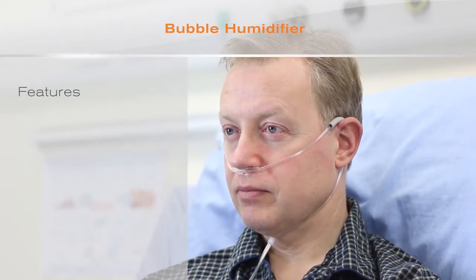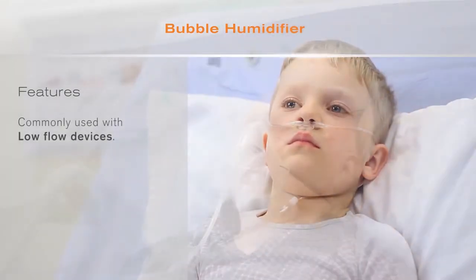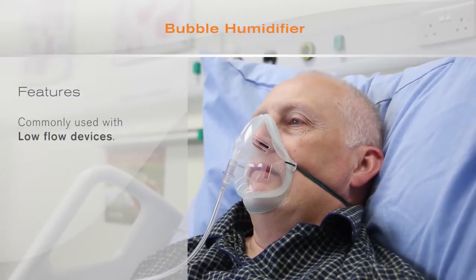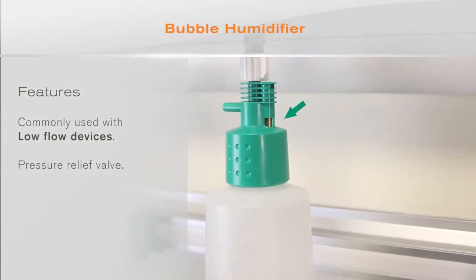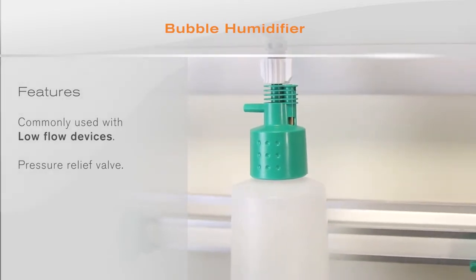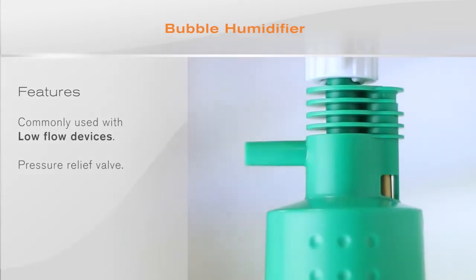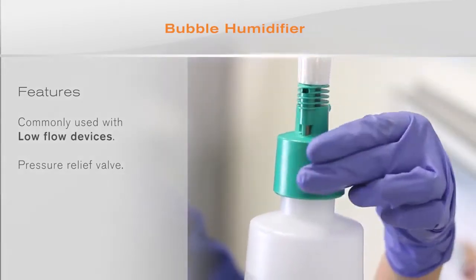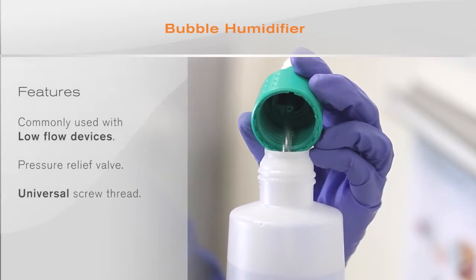Bubble humidifiers are most commonly used with low-flow devices such as nasal cannulae and medium concentration oxygen masks. Some models incorporate a pressure relief valve designed to prevent excessive pressures building up in the bottle should the oxygen tubing become occluded. Operation of the relief valve may also activate an audible warning, drawing the attention of the user to this problem. The head of the bubble humidifier may also incorporate a universal screw thread.